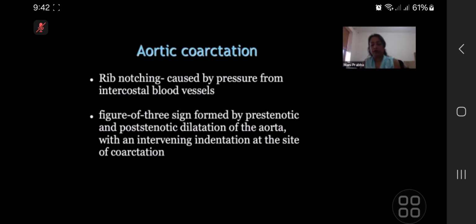The confirmation is usually by MRI scan these days, with no need to give radiation. Okay, next one. AP supine portable of a fairly young baby.